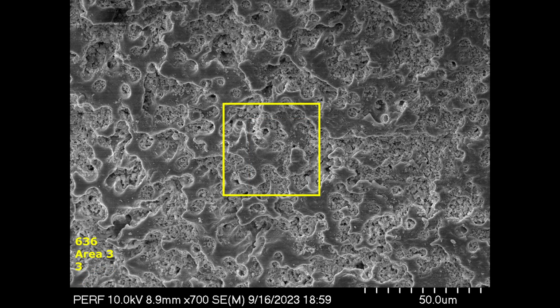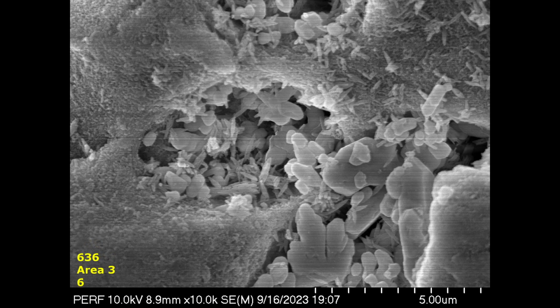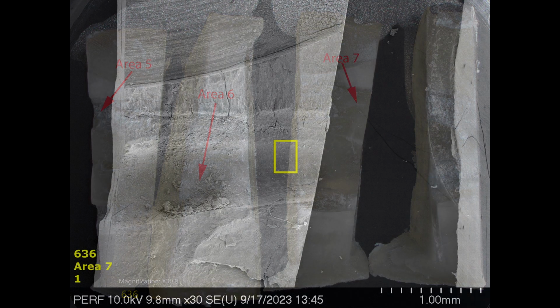Very little predentin. In some areas, you can see that the mineralization front has been very well eroded by the EDTA and is in a state of coming apart. And these fine little needle-like structures are part of the mineralized front being demineralized and then shattered by probably the effect of the laser. They look like little tiny microorganisms, but those are actually demineralizing parts of the mineralization front.